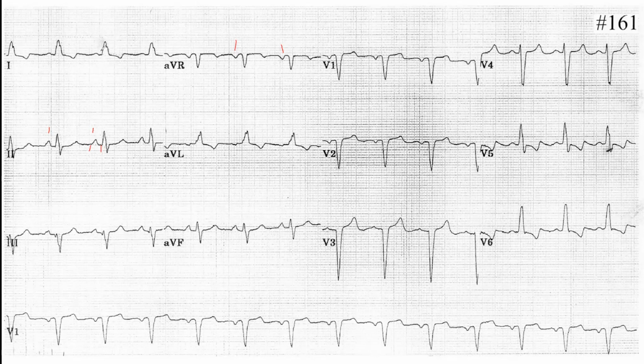Yes, very good. The QRS complex is wide, indicating... If you do have a sinus rhythm or supraventricular rhythm and a wide QRS, you have to think about... ventricular escape rhythm? No. Listen to me. Don't rush. We do have a sinus rhythm.